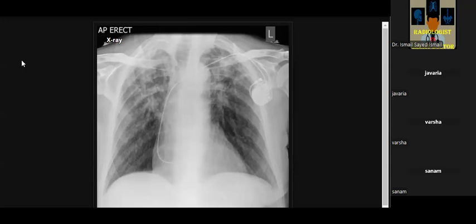Excellent. What about this device? Sorry, the pacemaker is seen, but please comment first on lines and tubes, okay? Yes, because maybe a safety issue is present on lines and the tubes, okay? Yes. This device is what?